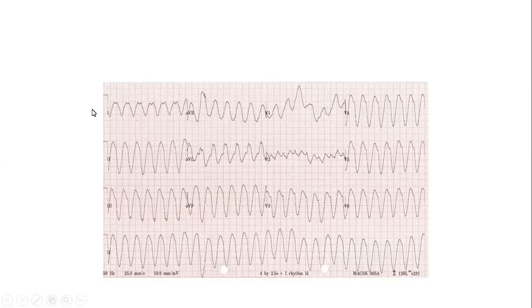What is this? Can I have a male to answer this one? What is this? Guys, come on.